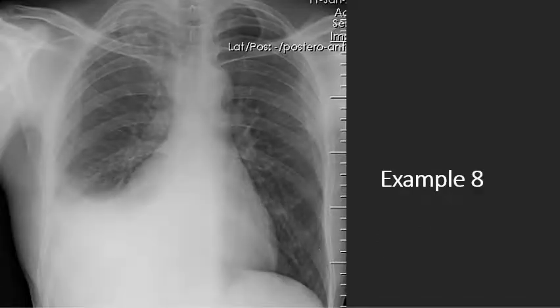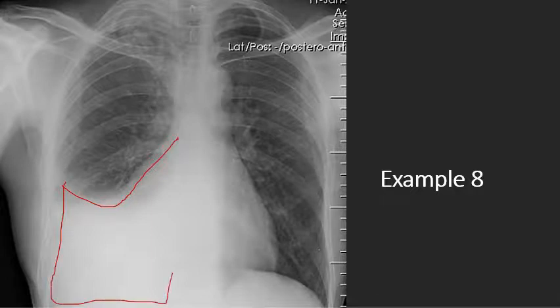So moving on, this one also does not look normal. This is not a normal finding right here, this hyper opaque area. So going down with our airway, here is our airway and our trachea and bronchi. Looking down on the bones, I don't see any acute fractures. Heart less than 2/3. The diaphragm, I can't even appreciate the right side. And then everything else, costophrenic angle not blunted. But this, what is this? It's just so hyper opaque, and I can't appreciate any other anatomy from it.